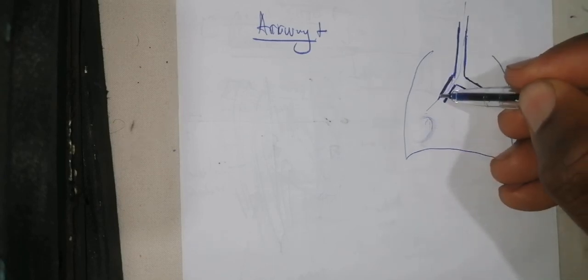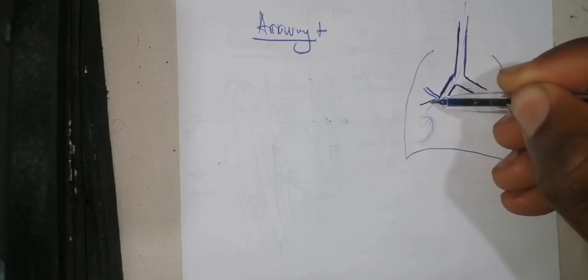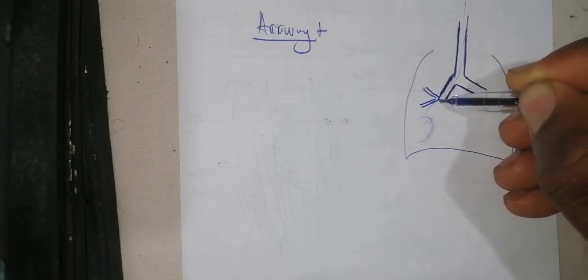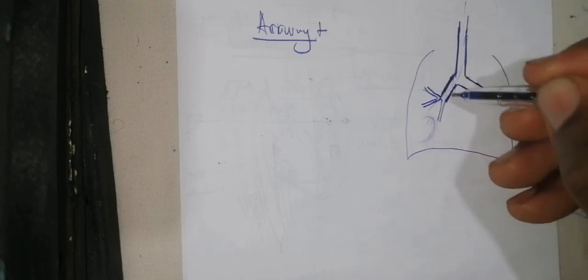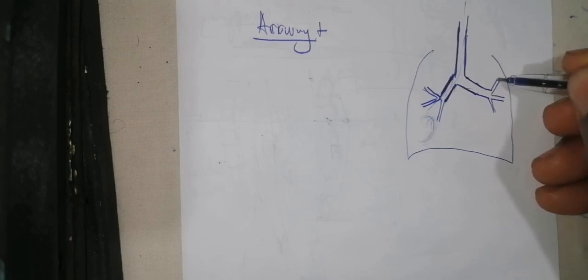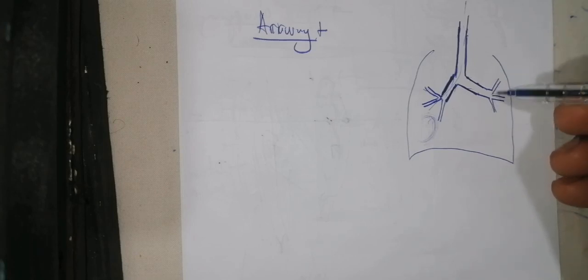So this is straighter. Now you're going to have the different bronchioles that come out. Basically, you have bronchioles that come out, and it's all inside. To distinguish them, you are going to see dark patterns, dark lines. When you see dark lines like that, you know that they are bronchioles. Here also, you're going to see dark lines. You know that they are bronchioles or secondary bronchi. These are the primary bronchi. These are the secondary bronchi.